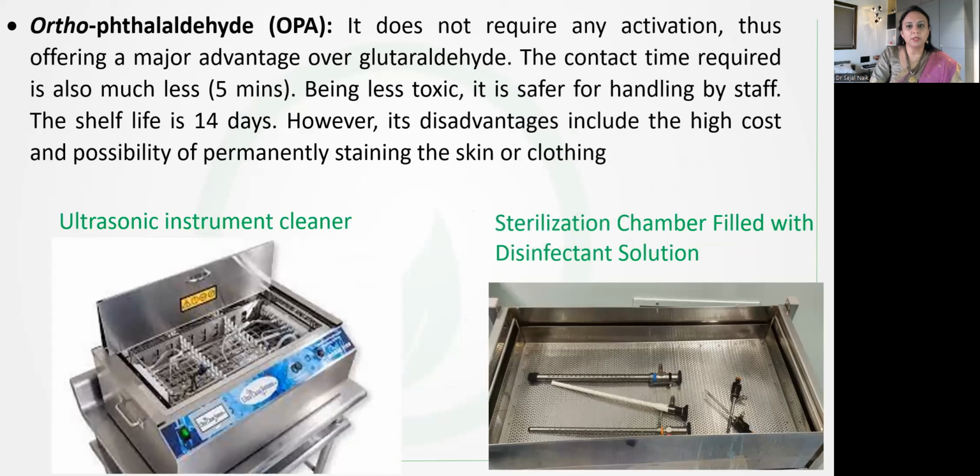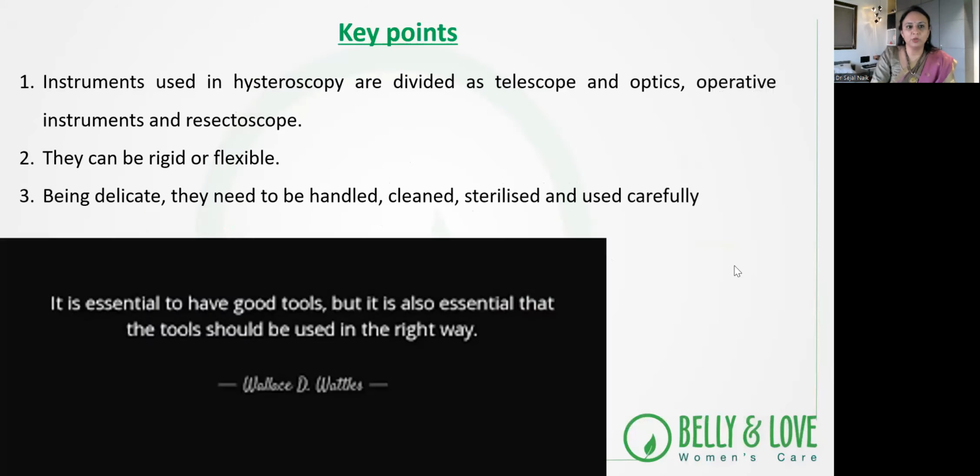OPA doesn't require activation, so it causes the fastest sterilization by the chemicals. It is less toxic and safe to handle, and its life is 14 days, so it can be used for a longer duration also. The instruments, if they have lots of clots, can be put into the ultrasonic instrument with its cleansing solution, then into the chamber that is filled with the disinfectant solution.